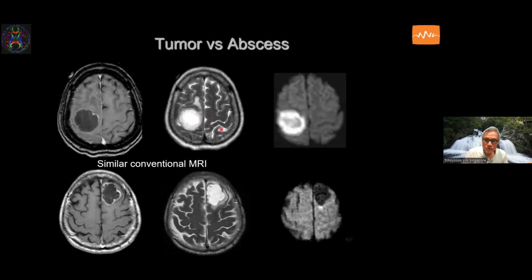We will use diffusion-weighted MR imaging, and this is a patient with high signal intensity, restricted diffusion. This patient is unrestricted, no high signal on DWI. This patient has an abscess. This has a non-abscess, probably tumor. This feature, where DWI can be very helpful to detect abscesses, works in untreated patients. Once antibiotics are given, this high signal intensity restricted diffusion will start to normalize and go away.